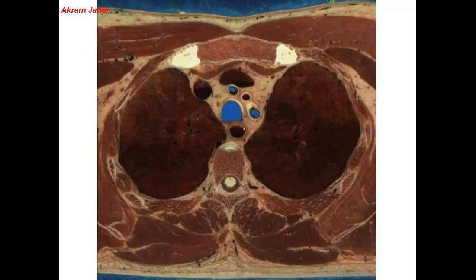Then we have the trachea and the esophagus. Again, on each side of the mediastinum is a lung, which is enclosed by the pleural cavities. The pectoral muscle here is pectoralis major, and deep to it pectoralis minor muscle is shown.